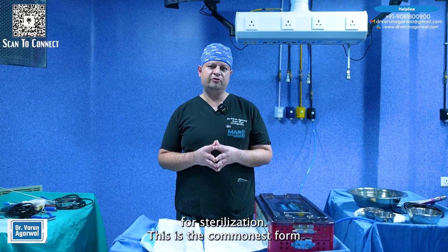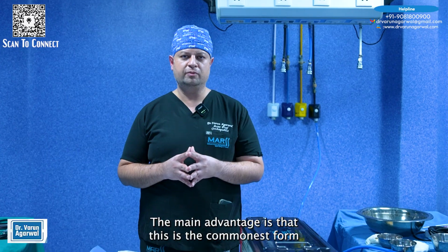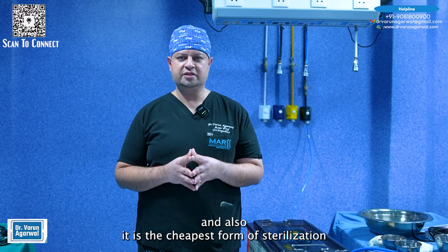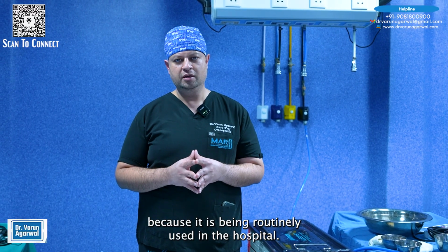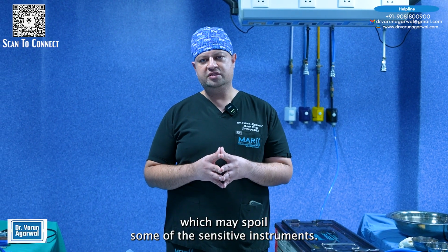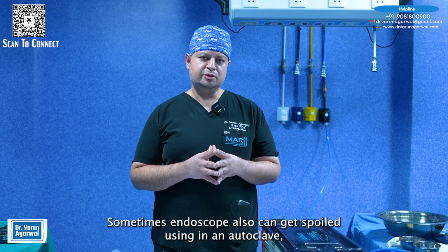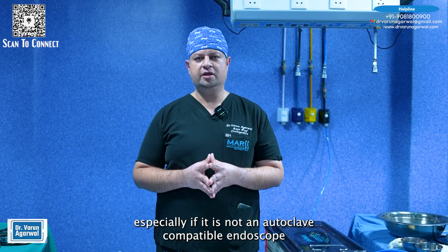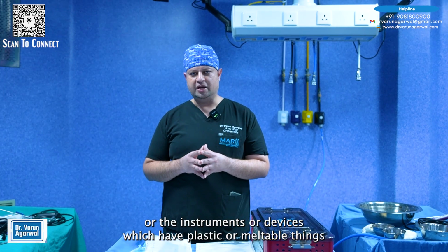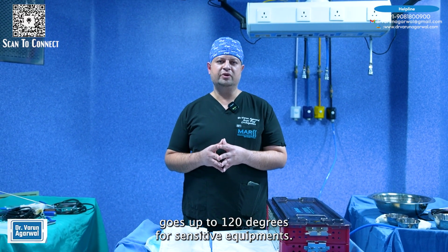This is the commonest form of sterilization which is available in any hospital. The main advantage is that it is the commonest form of sterilization which is available in any hospital, and also it is the cheapest form of sterilization because it is being routinely used in the hospital. The disadvantage is that it uses high pressure and temperature, which may spoil some of the sensitive instruments. Sometimes the endoscope also can get spoiled in an autoclave, especially if it is not an autoclave compatible endoscope, or the instruments or devices which have plastic or meltable things can get spoiled in an autoclave because the temperature goes up to 120 degrees.